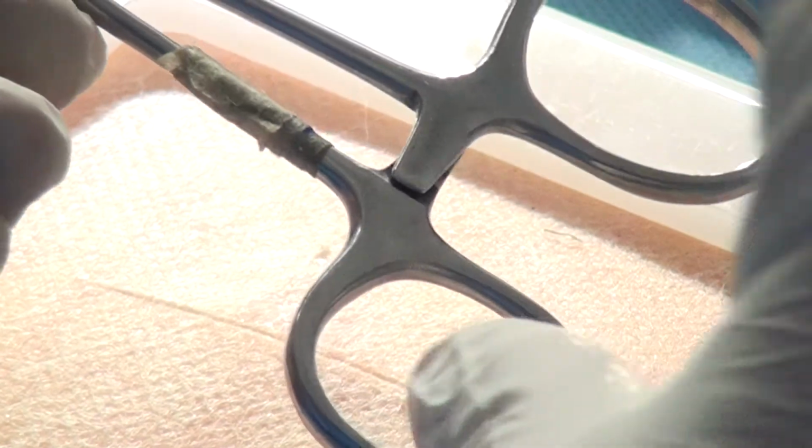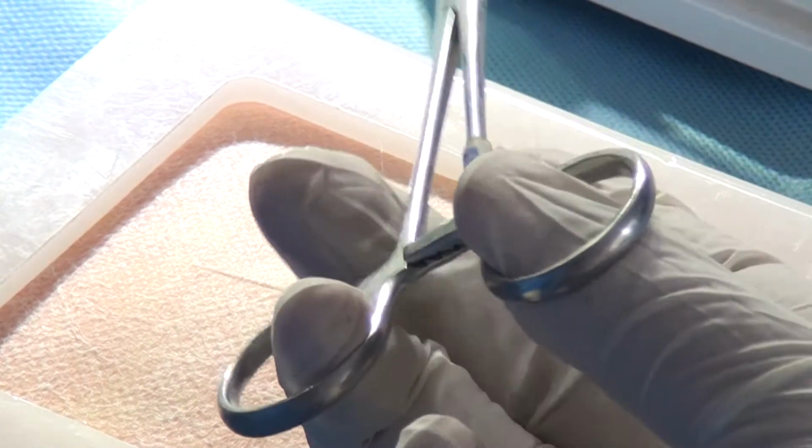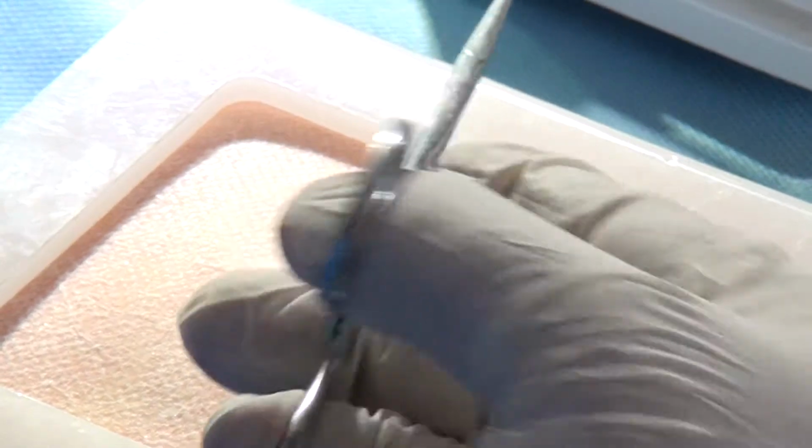I'm adjusting. The rings at the back don't enter completely, because you'll be stuck with the instrument. Just about distal to the terminal interphalangeal joint of the thumb and the ring finger, supported on the middle finger, and you'll be guided by the index.